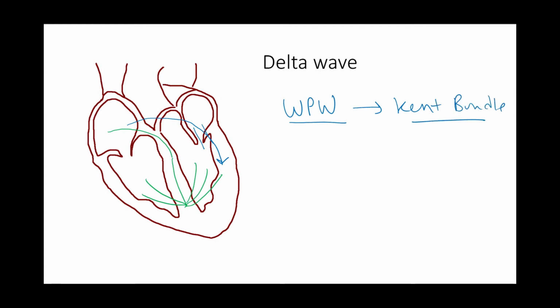And finally, in such a case, you would expect the EKG to show a P wave, an early depolarization of the ventricles through the accessory pathway, and then your T wave, with this early depolarization being called the delta wave. I also want to note that in Wolff-Parkinson-White syndrome, you don't always see a delta wave. This is because the accessory pathway can transmit signals either downwards, called antegrade, or back upwards, called retrograde. You would only see early depolarization of the ventricles if it's going downwards, or antegrade.